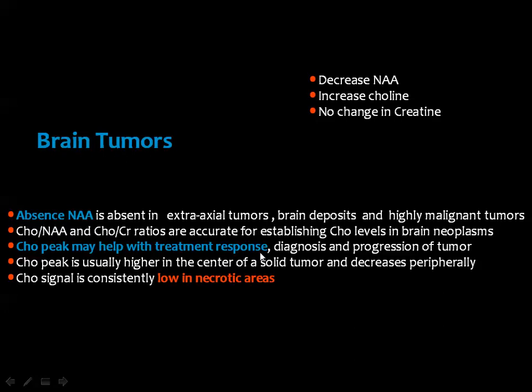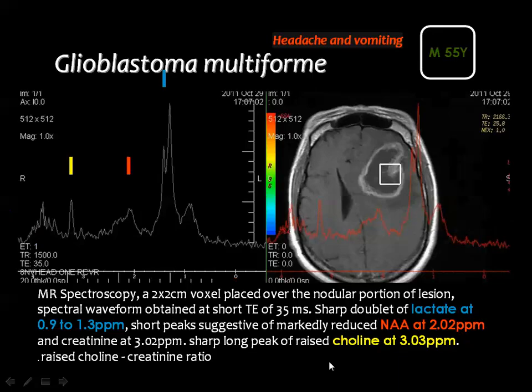If you see that the choline is high before treatment and starts to decrease after treatment, this indicates a good therapeutic response. And the choline signal is constantly low in necrotic areas and may be absent if there is extensive necrosis.